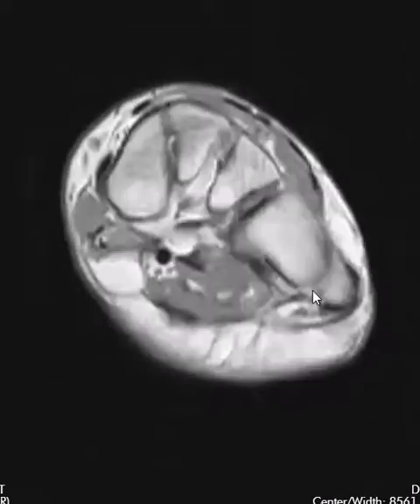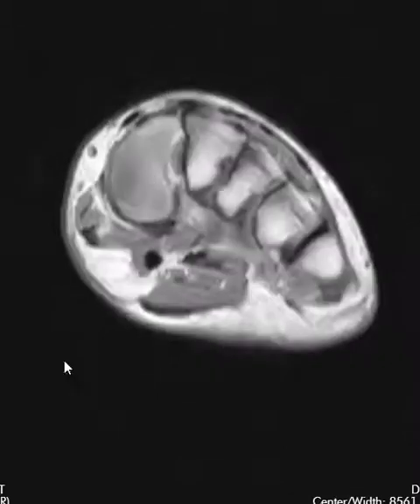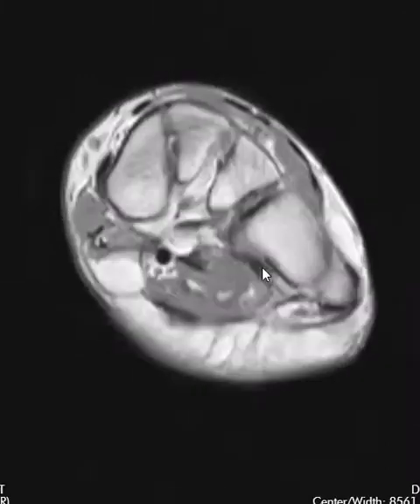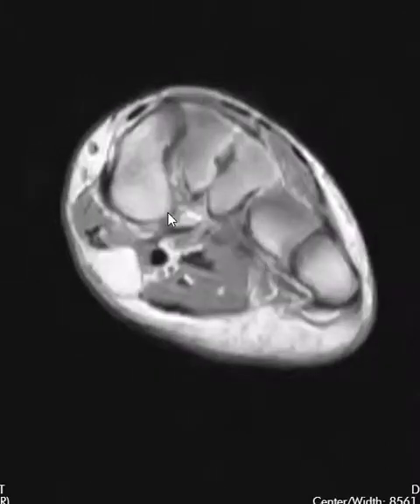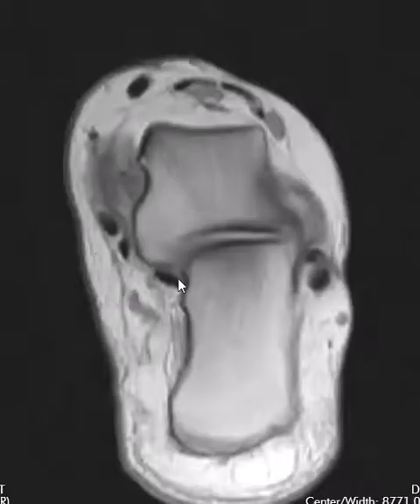that loops around. And the Peroneus longus will loop underneath, and it'll shoot over here to the base of the first metatarsal bone. This one you can't see. Normally you can see it pretty well, but there's magic angle phenomenon, but it goes right across horizontally and attaches right over here. And that's that, the 3 medial, 3 anterior, and 2 lateral tendons.